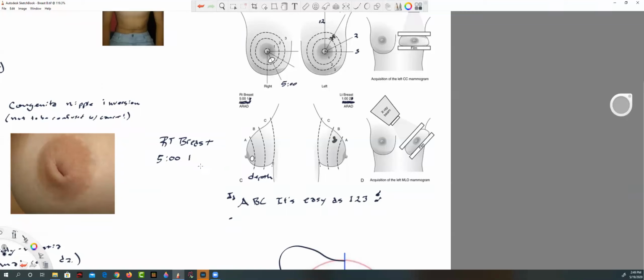All right. Now I see what they were doing. They weren't wrong. That's okay. I'm fixing it now. I wasn't looking at the entire image together. They are 2 different images. But anyway, okay. 1A.